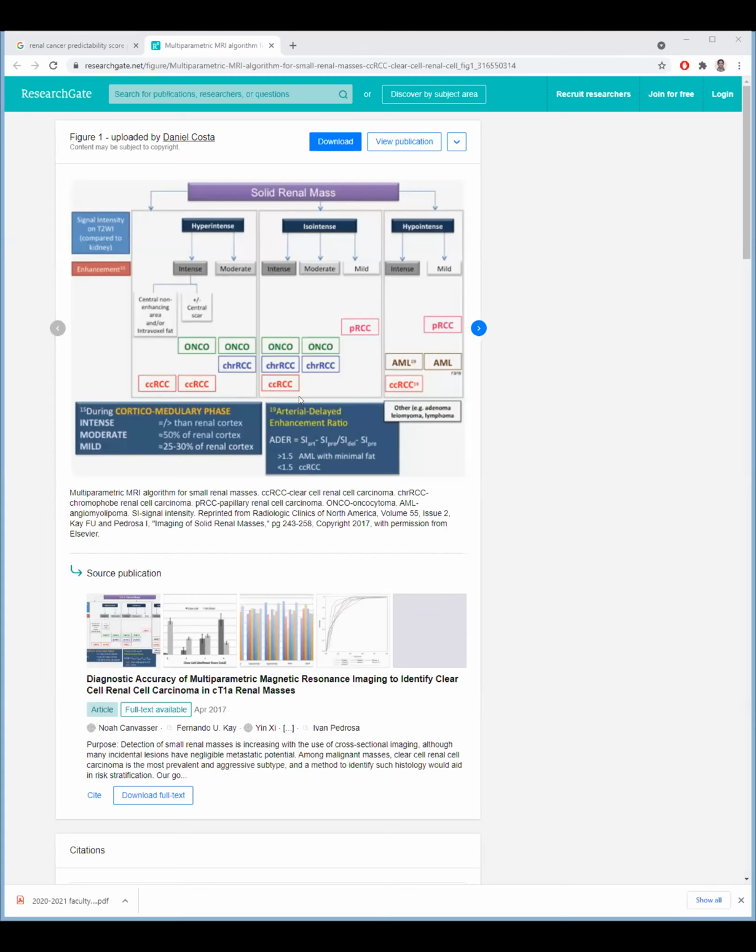And then if it had other characteristics, I have to look at this too. The tough part of this one is there are some vascular enhancement ratios. You've got to start getting out calculators and stuff, and that's where you start losing me. I guess the red box means the enhancement. The more it is enhanced, the higher it is predictive of a clear cell RCC. That's right. Less enhanced, so it's favored to be a papillary. So even if we had used this algorithm, we would have arrived at this was probably a papillary RCC, not a clear cell.